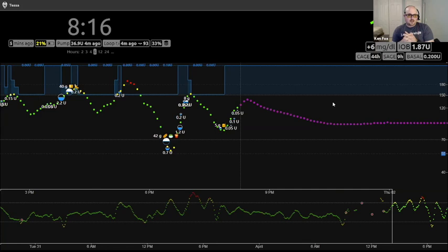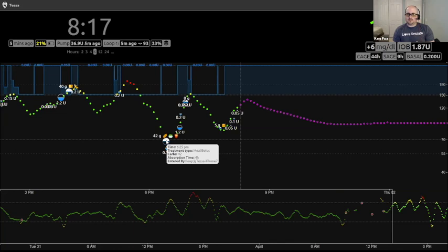And then you can see from a Loop perspective, the emojis you add to your carb entries show up here as well. And then very Loop specific, if you hover over a carb entry, you can see the absorption time and what device entered it. But the absorption time is unique to Loop. You won't see this if you're using Nightscout by itself as a logging tool. But you can see it here as the absorption time listed.